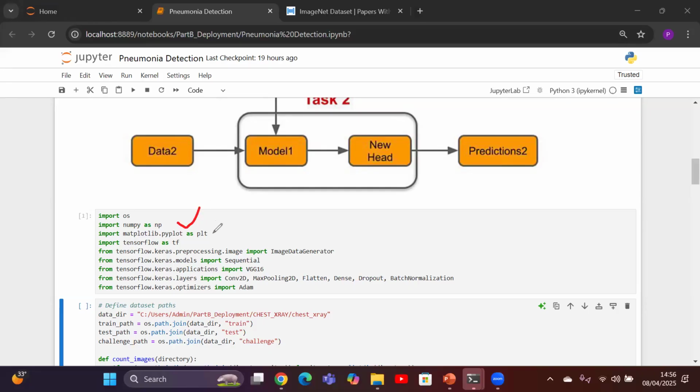And we are going to take Matplotlib. We have some visuals which represent how the X-rays of normal and pneumonia are different. Also, we will take advantage of TensorFlow, which is a framework for numerical and tensor-based calculation. We will be using pre-processing and also the sequential model. And as I mentioned, this is going to be a transfer learning technique, so VGG16 we are going to use.